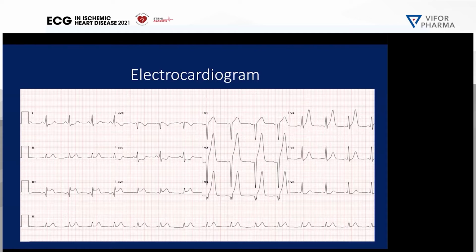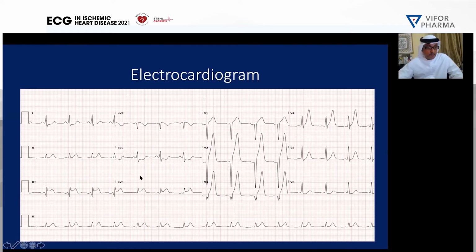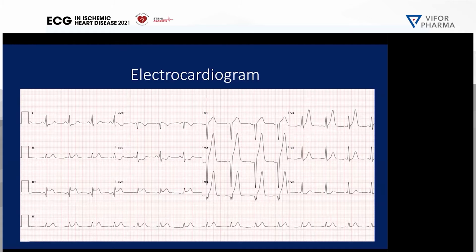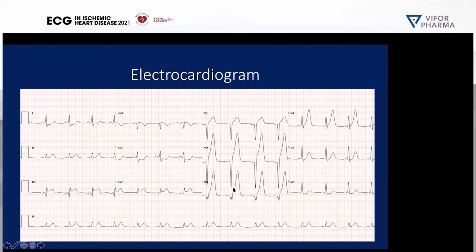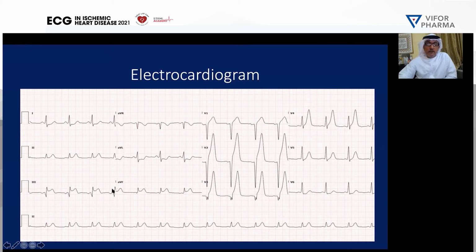Now we'll go to the segment. We have huge ST segment elevation with peaked T waves in the anterior leads and also in the inferior leads. Agree with me, Dr. Zubaidi? Yes, definitely. And in V1 to V3 and aVF, there is a Q wave. So the question is, this is inferior, definitely inferior, but what about this anterior? Is it old, new? What do you think? The anterior looks hyperacute, the T waves, although the R waves are already down, which sometimes indicates a delay in presentation, a late presentation or an old infarction. But the hyperacute T waves make me very suspicious that this is an acute anterior.